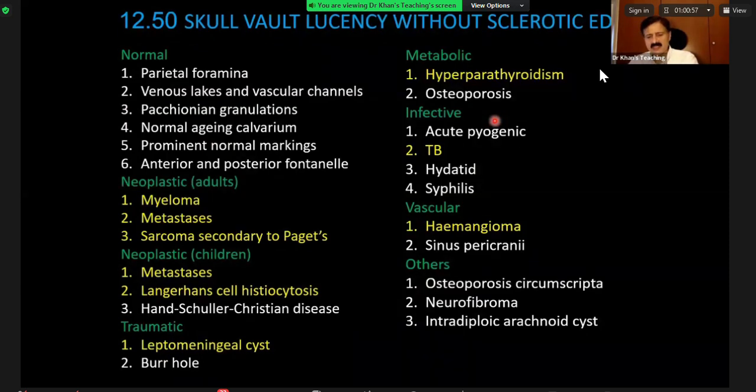So with that, LCH can also cause skull lesions. And this is a differential diagnosis in your book. Skull lucency without sclerotic edge. And LCH is given there, Langerhans cell histiocytosis.